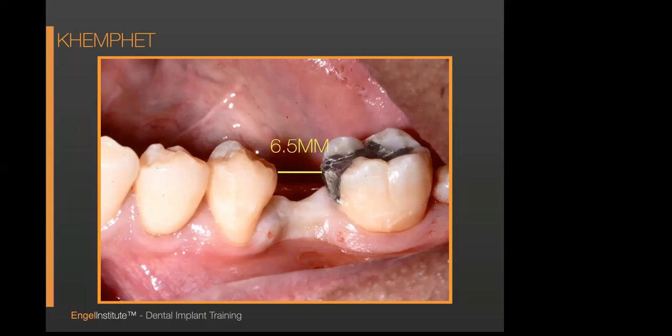And I kind of refrain from telling dentists what they should do. If they come to me for an implant, I give them an implant. In this case, I think that they could figure out that they should polish. Nevertheless, the problem here is that if I have a 5 millimeter sleeve plus all the acrylic to make the sleeve stable, it won't fit in there. So let's look at this case. The one reason that I would use a pilot sleeve would be for proximal spacing, that I didn't have enough.